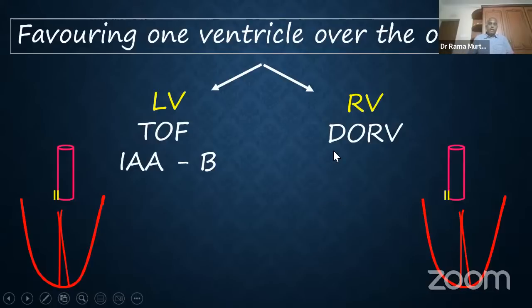After all, what is double outlet right ventricle? By definition, it is when the right ventricle supports more than 1.5 of the great arteries. So one great artery, it has supported, yes, the pulmonary artery. The other great artery, which is overriding, the aorta, which is in question now, is more committed to the right ventricle than the left ventricle. So the right ventricle, in effect, will be supporting one full great artery and more than half of the second great artery, therefore meriting the diagnosis of DORV. So we will, when you see all the pictures, all this will come to life and you will understand.